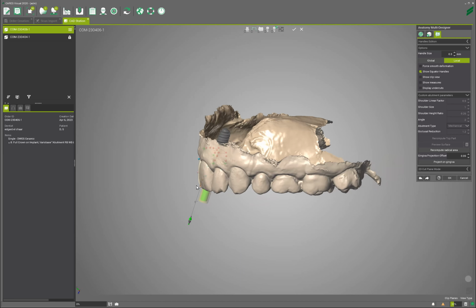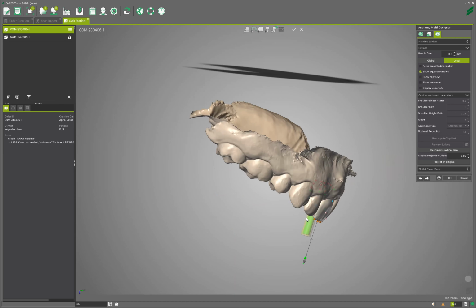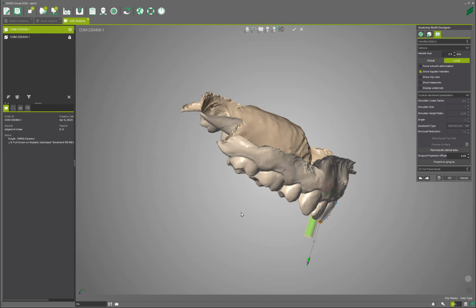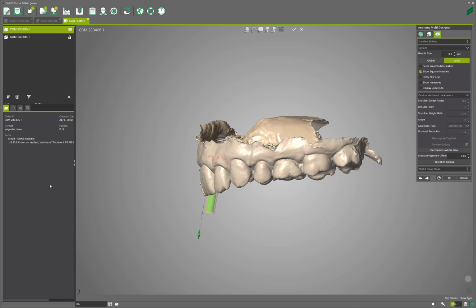And I am looking here and I see that this is a bit inward. And I made another point here just to flatten it like the other one. Yet here I see I have a little bit of a, okay, so those are the fix-ups that I need to make from that perspective here.